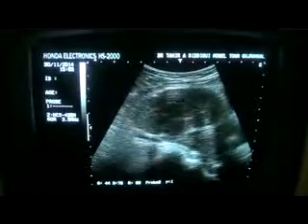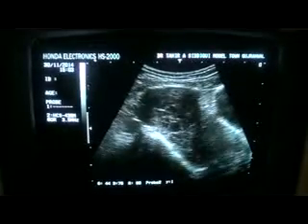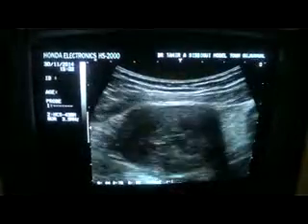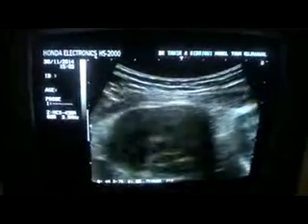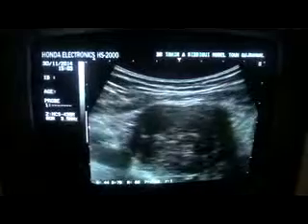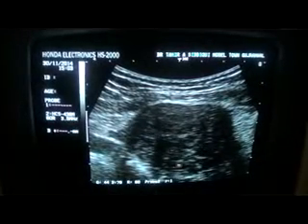Now as regarding this fibroid, you will see multiple internal cystic areas. These are represented. This is the cystic area, another.